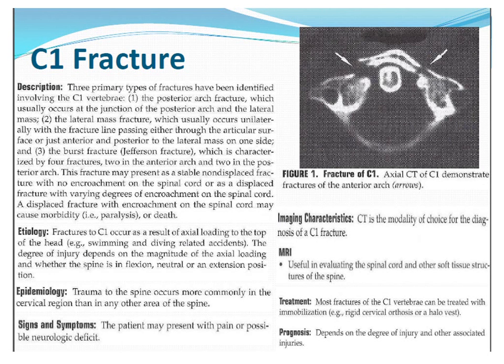Now, fortunately, in this case, when the C1 vertebral body bursts out, it's not going to go posteriorly. None of the fragments are going to go posteriorly and into the spinal canal, unlike in a burst fracture of the other vertebral bodies. So even though it's not necessarily considered a stable fracture in all cases, the patients usually have a lot more room around their cord up at that point. And so chances are these can heal without surgery. Of course, they're going to have to be stabilized in a neck brace.